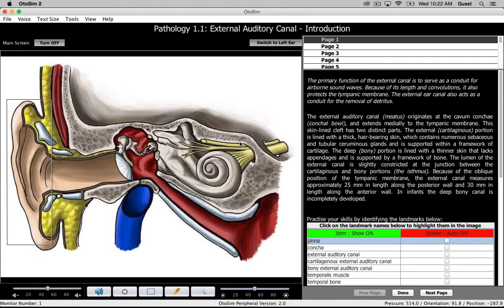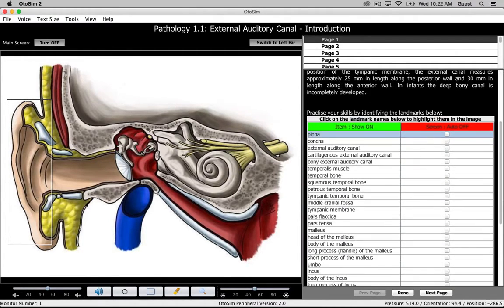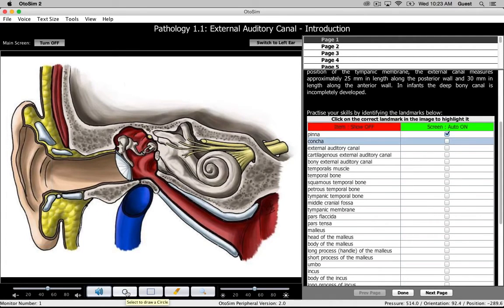So in the introduction section now, we will repeat some of the things that we learned in the first part with respect to our anatomical knowledge. And you'll see again when these two charts appear that we now can identify the structures on the main screen. This first picture is not to be used in the simulator, but again to review some of the relevant anatomy, is the teaching ability of an instructor to the student.